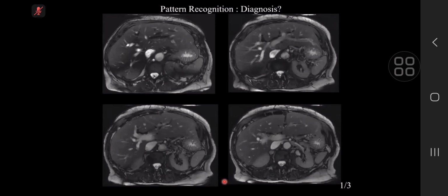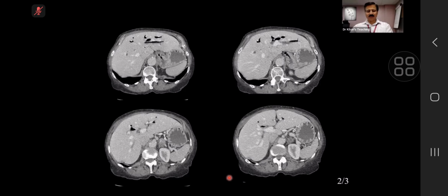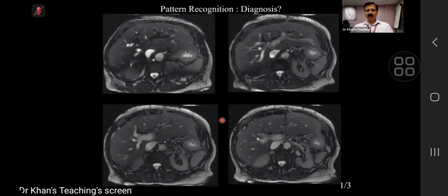Okay, so I can't see any focal hepatic lesions. Is it generalized hepatic steatosis? Okay. So what was that? Air. So this is pneumobilia, isn't it? Yeah. So the point I am making is that if you go back, you see there is pneumobilia here.